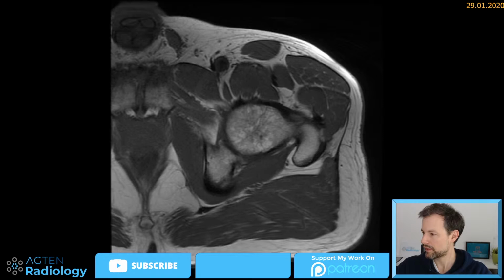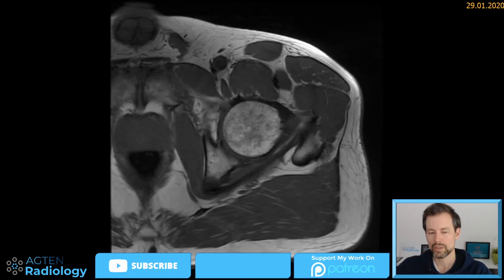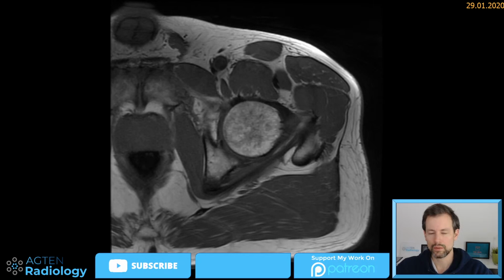Okay, do you determine the alpha angle? I never measure the alpha angle, to be honest. Not on radiographs, not on MR. I think it's kind of pointless. Just basically because of the overlap: if you remember the curve from asymptomatic patients and the curve of the values from symptomatic patients, there is so much overlap between the two curves that it renders the measurements basically useless. Maybe not completely useless, but if orthopedic surgeons want to know this value, they can measure it themselves. Also, there is so much inter-reader variability, so I don't care.